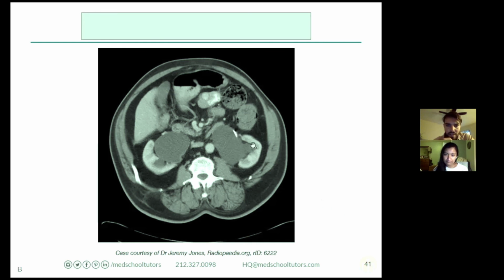Especially on my left kidney, I can see a little bit of my normal renal calyces. But within that, I see this less dense, darker gray area that's kind of homogeneous. That's telling me that there's probably some type of fluid in there, so these homogeneous, fluid-filled structures within the kidney. So let's see what we're thinking here.